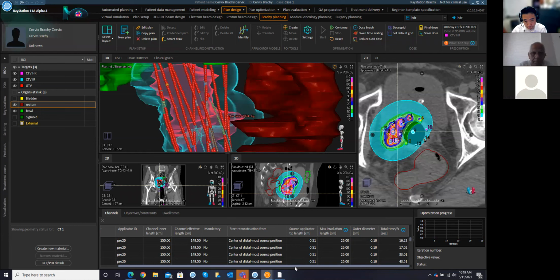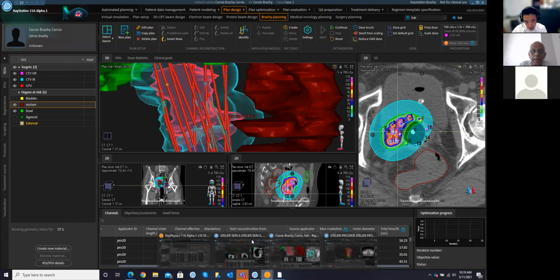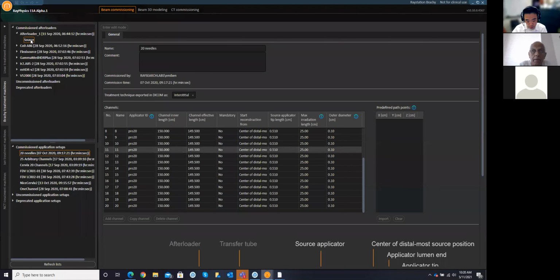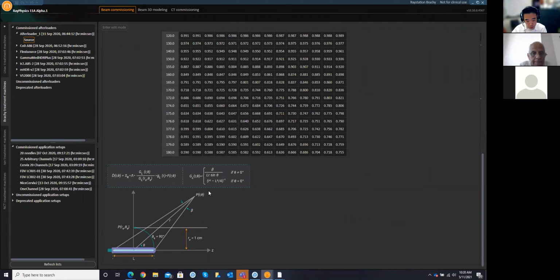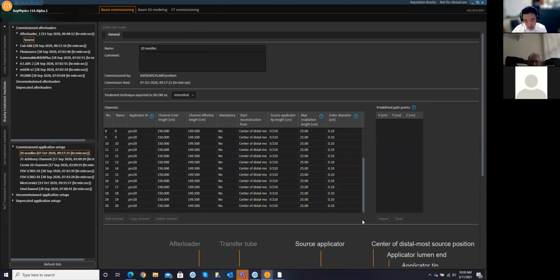Do you mind further explaining that use case as you were pointing out? Maybe the question isn't clear. The use case again, as far as what the mistake could be, or how would you define it? Maybe David, if you could pull up the RayPhysics source definition diagram. Yeah, right here, and scroll down to the picture. Here, or do you want the applicator? The applicator. There we go.